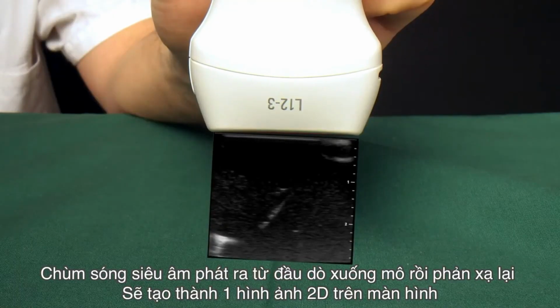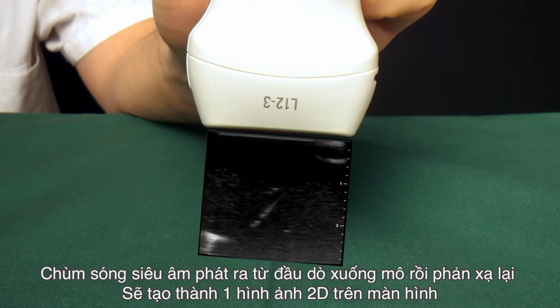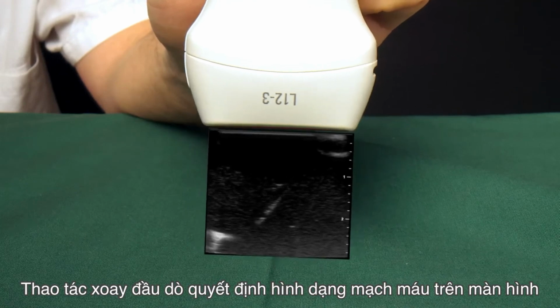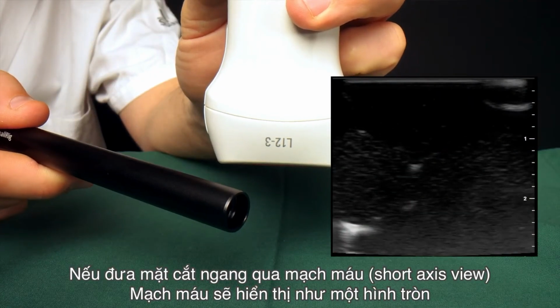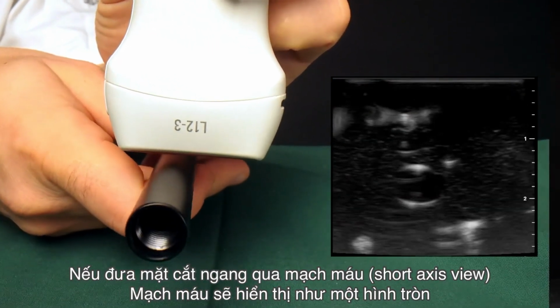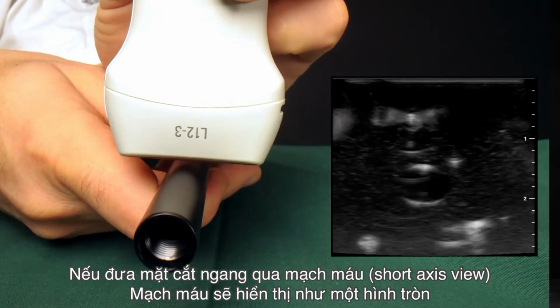The ultrasound fan originating from the probe creates a 2D picture on the screen. How we rotate the probe determines how we visualize the vessel in this 2D picture. Now the vessel is essentially a long tube. If we place the plane across the vessel, we get the short axis view, and the tube appears as a circle.